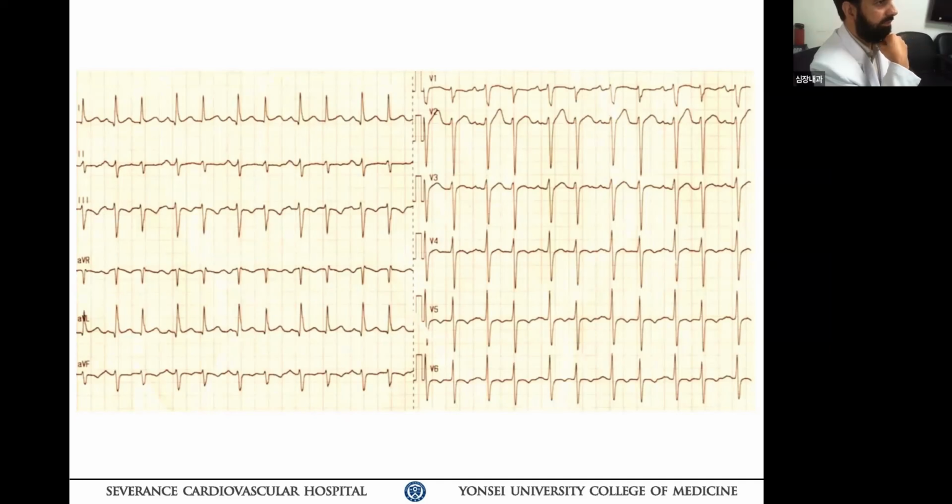So there are two possibilities. Number one, there is a hidden APC wave or retrograde P wave from the first QRS that is overlapped. But I cannot see the P wave; the retrograde P wave morphology in leads 2, 3, aVF we can define, but it's hard to say. But still, I cannot exclude the diagnosis of 1 to 2 conduction utilizing dual AV nodal physiology. It is just very interesting to know.